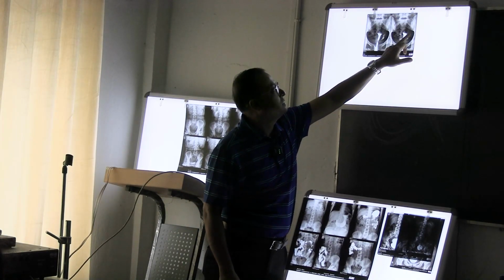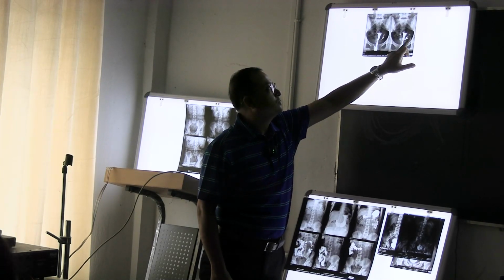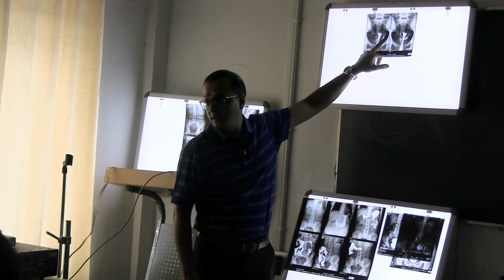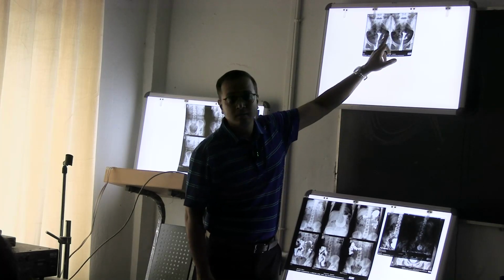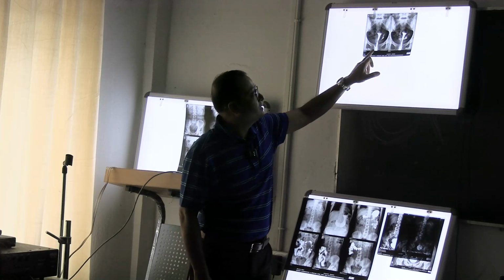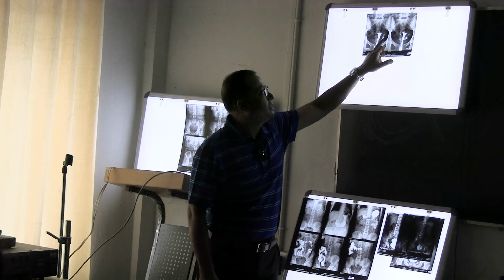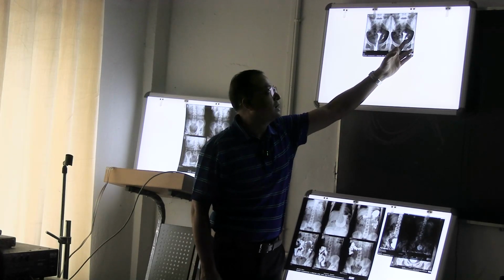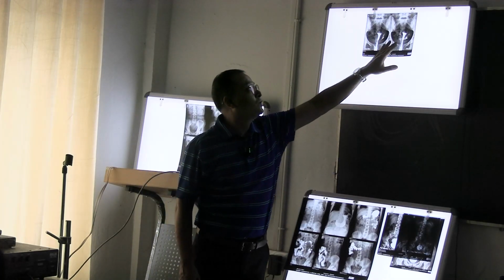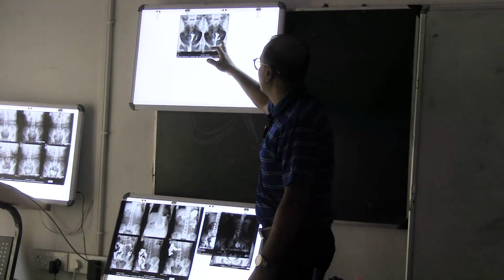This is the fallopian tube we are seeing here. On this side you are seeing the dye coming out, right, to the individual. This side the dye is there. In this picture as well, this time we have the dye here. Do you see any dye in here? What you are seeing is that the dye is ejected through this particular birth tract, coming through the uterine tube, getting into the cavity of the peritoneum on this side, which you call the left side of the individual. On the right side we do not see any marks. Why are we not seeing any marks on the right side, and why is this present only on the left side?